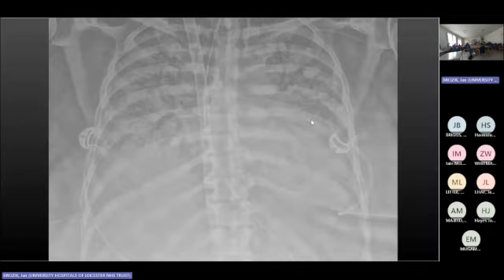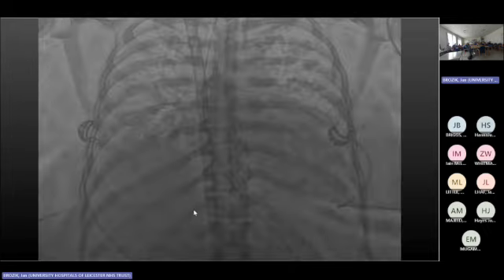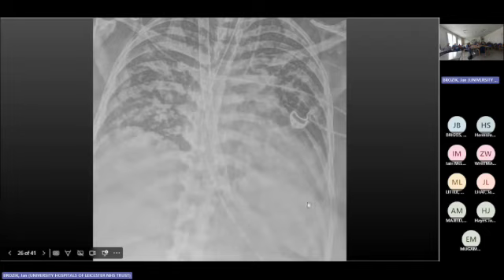It can help you. Another case that was during the pandemic, so we are familiar with these images. Someone who has diffuse alveolar damage, or clinically ARDS, and they have an ECMO cannula. I think everyone is happy with that. I just inverted it. It's exactly the same image. It's clear, and because they are critically ill patients, they have a series of X-rays. So we're happy with this chest X-ray. Are you happy with this chest X-ray?